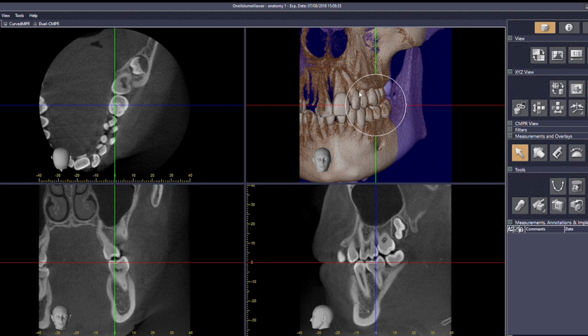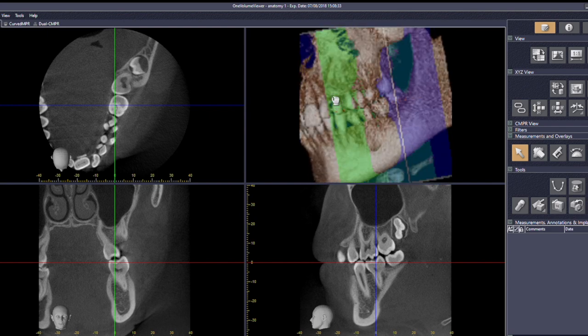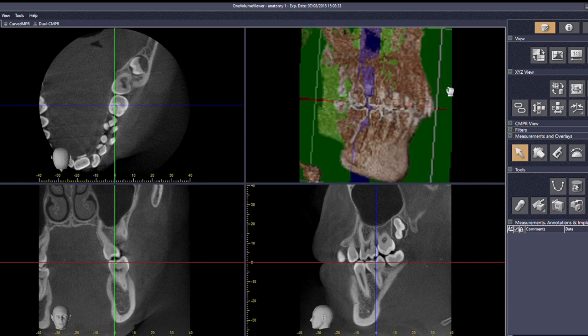So I personally like to decouple it, and the decoupling button is over here. See? Decouple slices and volume rendering, and that's all it does. That's the volume, that's the slices, and it's got a little link. If I click it, it will delink it, and see now we've got 2 chain links that are separate, and this view here is now able to be moved separately. So what I'm doing here, just using my normal left mouse clicker, and I can drag and move this person around.